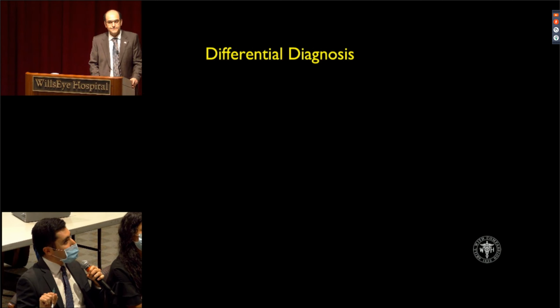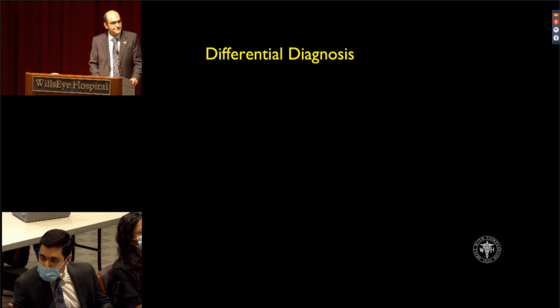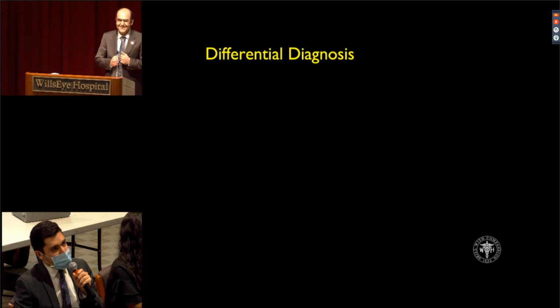But I think your only three differentials here are syphilis, luetic disease, and spirochetal disease. That's fair, as the OCT is very, very telling in this case.